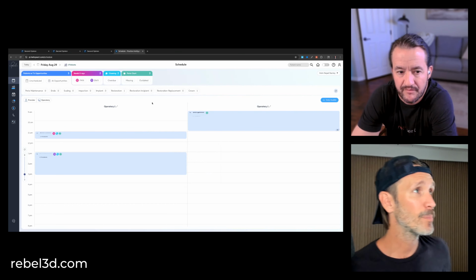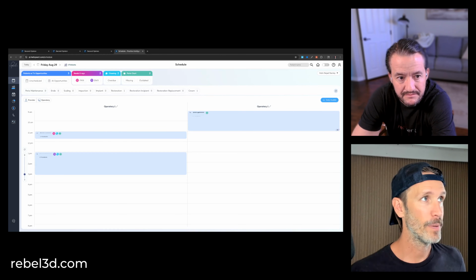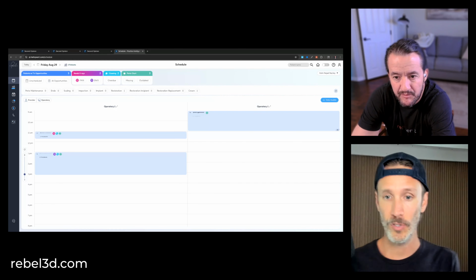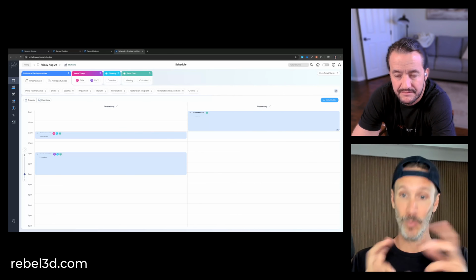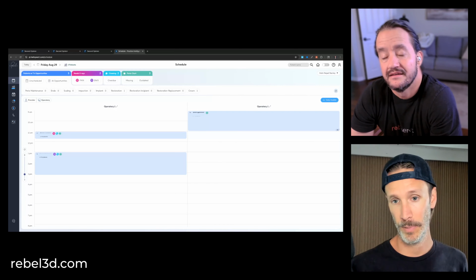And then on the top, it summarizes what's happening in your schedule today. We have 3 patients that need to get perio-charted, 2 patients that are overdue for a cleaning, 2 patients that need radiographs, and there's 3 patients that have treatment opportunities. So treatment opportunities are things that the AI found that could be false positive, could be false negative, but we'd like for the doctor to take a look at and see if it's something that they want a treatment plan.